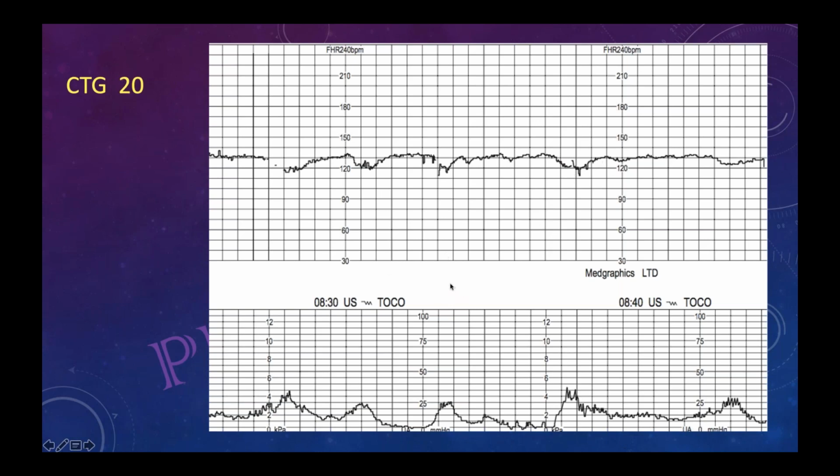No, where is it? Decelerations? These are decelerations. These are decelerations. Very good, excellent. Who said early? Very good. So these are a copy, total copy. You see this, you see this. Yes, a mirror image. Yeah, these are early decelerations.